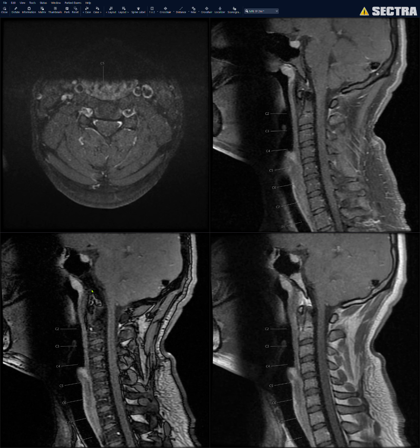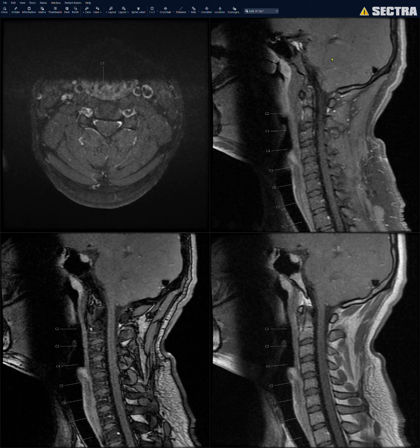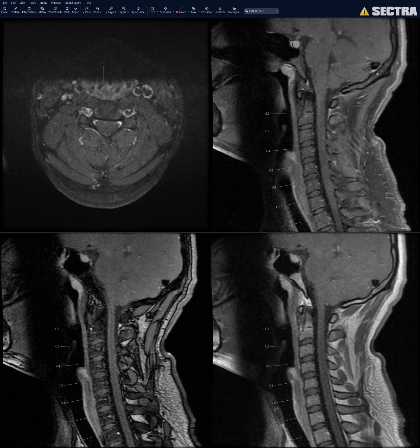And so I look at it like the other sagittal sequences, where I look at the brain, make sure there's no abnormal enhancing mass, cerebellopontine angles. I look at the pituitary gland, see that it's nice and enhancing. I don't see any abnormal sellar or parasellar mass. Okay, I look at the cord, make sure there's no abnormal cord enhancement. Look carefully, in the setting of multiple sclerosis, make sure you don't have any enhancing cord lesions.